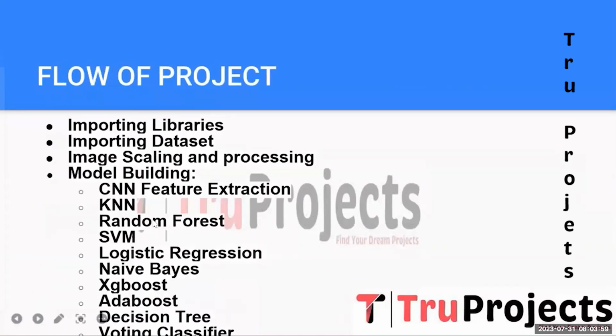And to know about the flow of the project, these are the steps we need to discuss. The first one is importing the libraries. In this step, the necessary Python libraries are imported, such as TensorFlow, sklearn, Pandas, and Flask. These libraries provide the essential functions to perform the subsequent tasks efficiently. The second one is importing the dataset. The dataset containing retinal images of patients with diabetes is loaded into the project. Each image is associated with a corresponding label indicating the severity of the diabetic retinopathy.